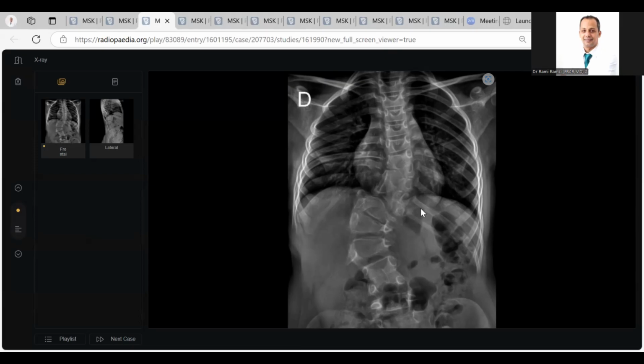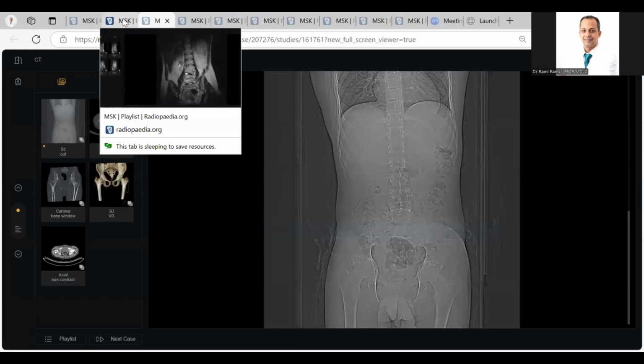I bring this case to enumerate different types of vertebral anomaly, and I think this is also a partial vertebral block. Here also there are some blocks, like this. This is the reason that I brought this case. Please, next candidate, prepare yourself.